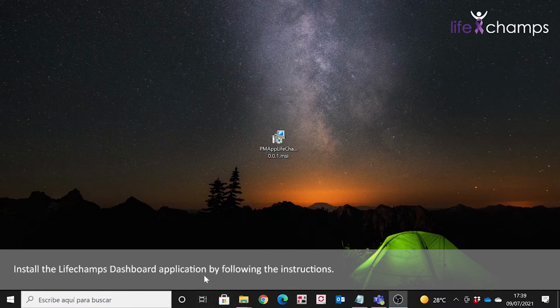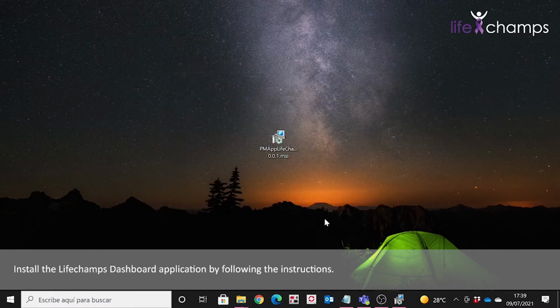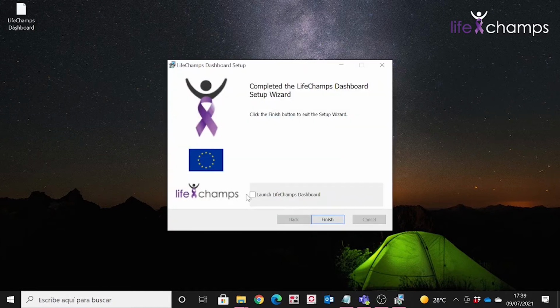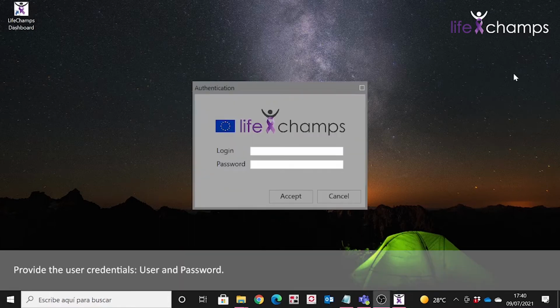First, install the LifeChamps Dashboard application by following the instructions. The installation is complete. Launch the LifeChamps dashboard. Next, provide the user credentials, user and password.